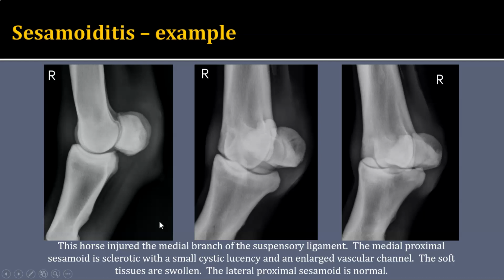Here's an example of a patient where I have both oblique views. So we have the lateral view and then the DMPL and the DLPM view. Remember, we have to have that radiographic marker on there to help us determine when we're in the fetlock, what is more medial and what is more lateral. So remember that marker always goes at the more lateral aspect. So this is dorsolateral here, palmar medial. This is dorsal medial and palmar lateral.